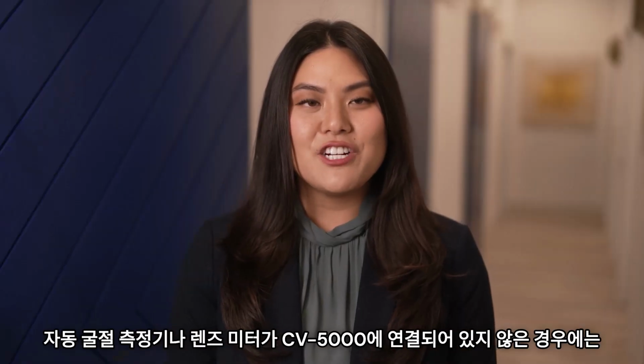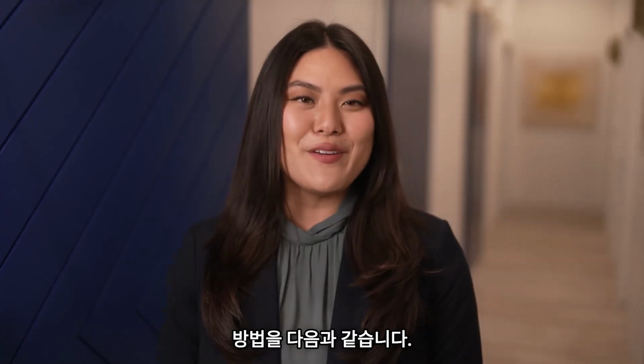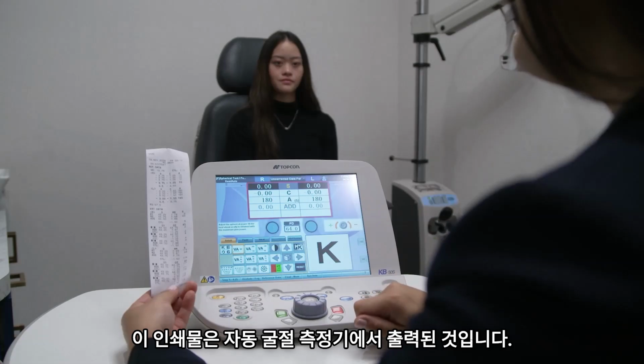If your autorefractor and/or Lensmeter is not connected to the CV5000, you can easily enter the data manually. Let me show you how. First, you will need your data from the autorefractor or Lensmeter. This printout happens to be from the autorefractor.